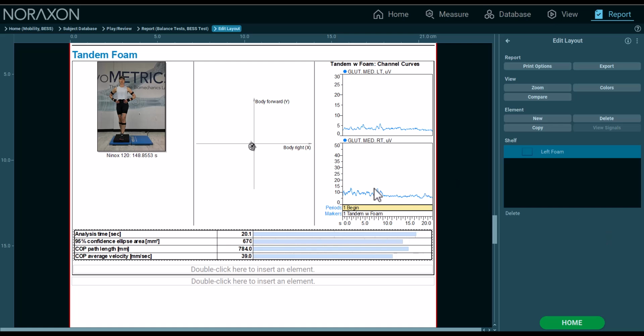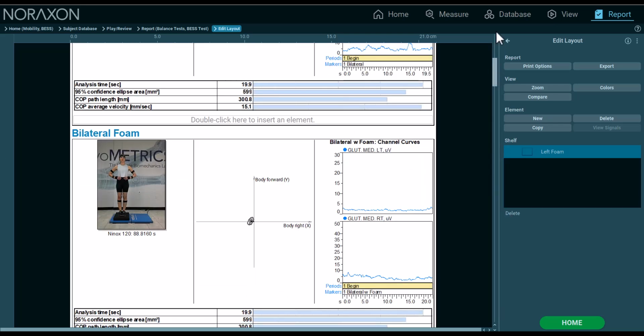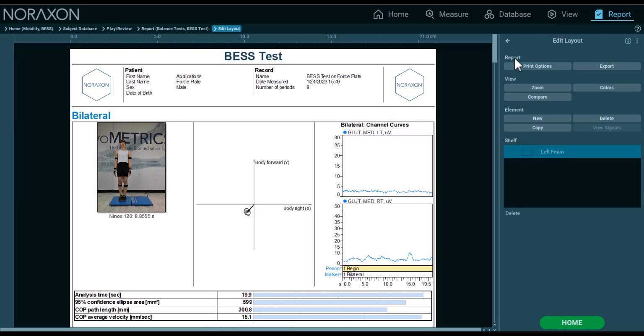So you can do a whole bunch of other things with the reporting. I chose a couple of things to focus on, like that center of pressure data, as well as the muscle activation patterns on the gluteus medius throughout these single leg balance activities. But you can also add that motion data in. You could add more text boxes to log scores and things like that. But hopefully this gives you a good idea of the capabilities so far.